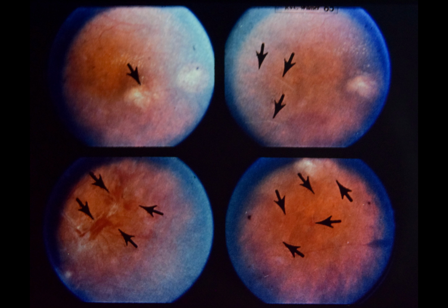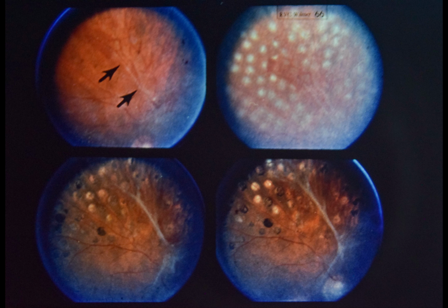Slide 66. Photocoagulation treatment for Eales disease with proliferative retinopathy. This 32-year-old white male was described in the previous slide. All photographs are of the superior temporal fundus, right eye. Upper left, adjacent to disc, note intravitreal neovascularization accompanied by fibrous tissue.